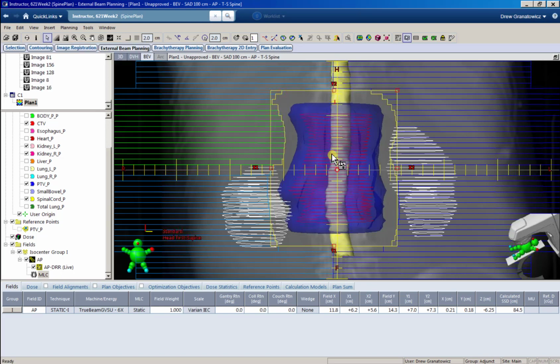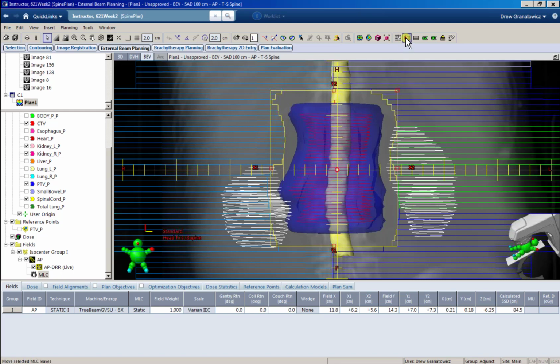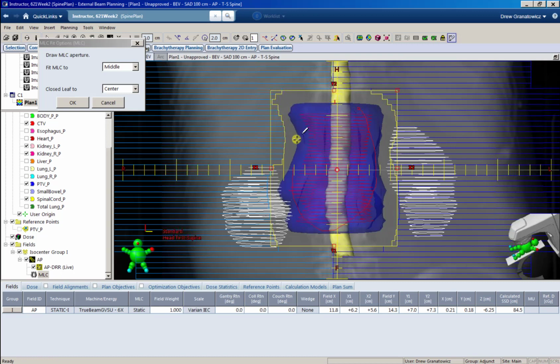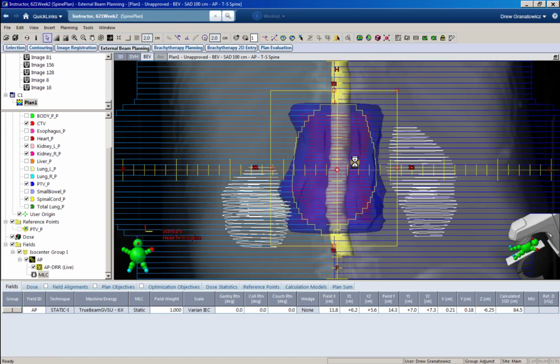Okay, just like that. So that's kind of how you do this manually. And then of course you can start adjusting other leaves or pick a different range. Or you can just completely start over to change the entire block.